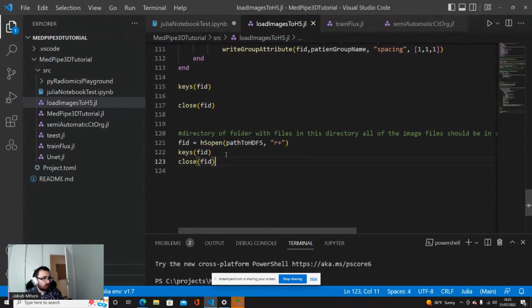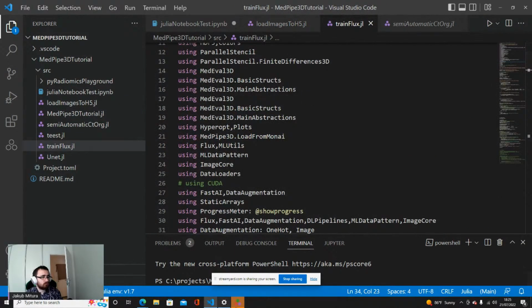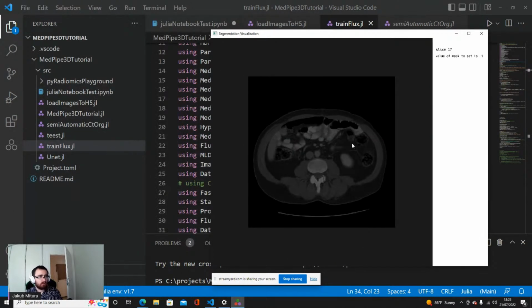And yeah, this is just for checking. Here, okay. So here is the data that is prepared already. You see there is a lot of padding. For this case, I chose the padding 0. It should be basically the padding the same as the corners.